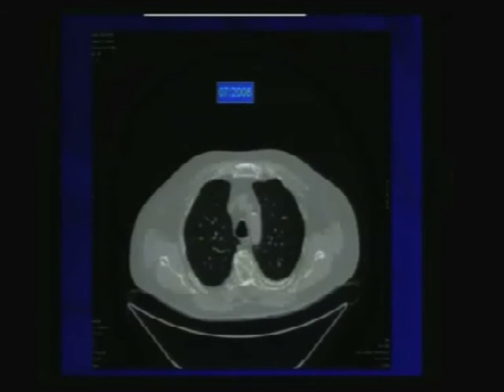2008, do you see the nodule? It's here. This is too big to be a vessel. You know how the vessels are branching as they go to the periphery? 2007. Well, actually, it looks bigger. So if it was bigger a year before, then what do you do usually? You forget about it. But the problem with that, being such a small nodule, is you have to be careful also about making sure that you did cut exactly at the same level.